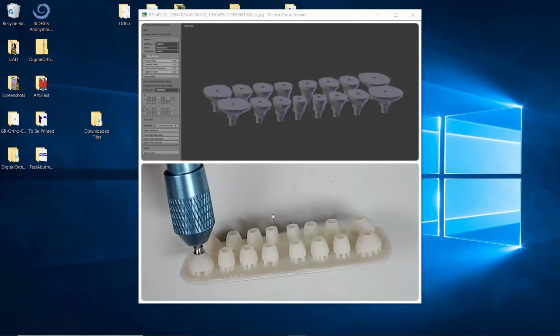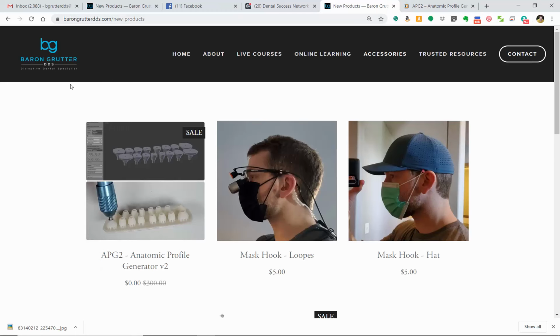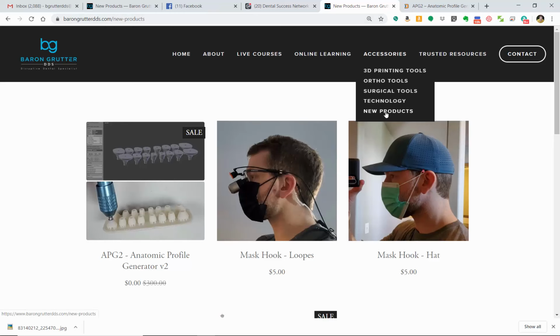And so when you download it, first of all, where are you going to download it? There's a couple different places you can go right now. If you go to d3tool.com, this is Dr. Patrick Moore's website. He's my partner in this project. This is his website where he has some other software he sells and whatnot. So you can buy it here under the shop center. And then also you can come into my website, barongrutterdds.com, and go under /new products or accessory new products.